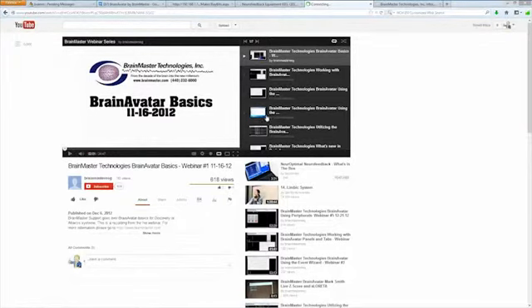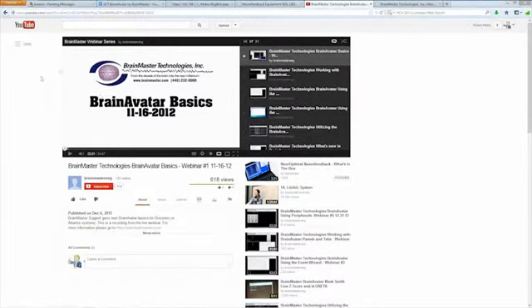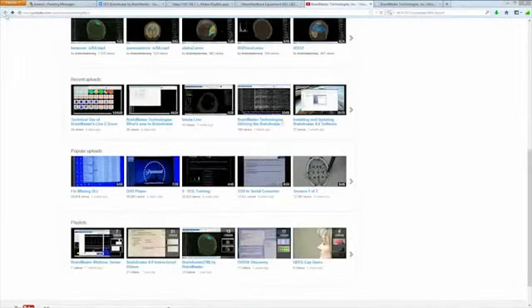I'm going to pause right here. I believe it is this one, using the Event Wizard. Actually, I think it's number 3. Yes. So a lot of the things that I'm covering right now are also covered in that one. Should you need any more information, or maybe I didn't cover something because I have already done it, that's a nice tool that you have.